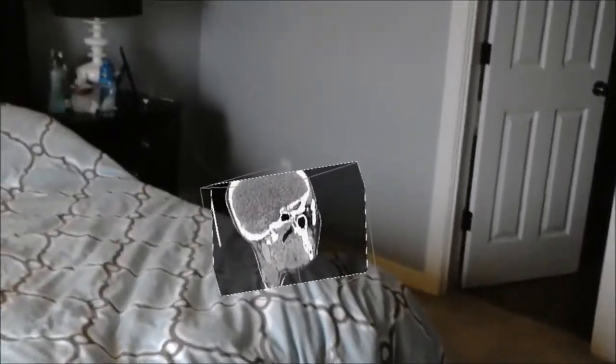So right now we're going to make a 3D reconstruction. The first step is to define the isosurface threshold, interaction mode threshold, so that we can see we've got it already set to about skin. If I wanted to make a bone reconstruction, I would do something like this, but we'll set it to skin. Okay. Build marching cubes. Hide slice.